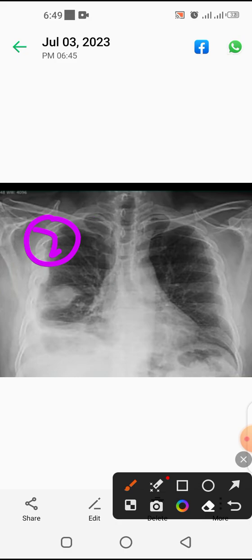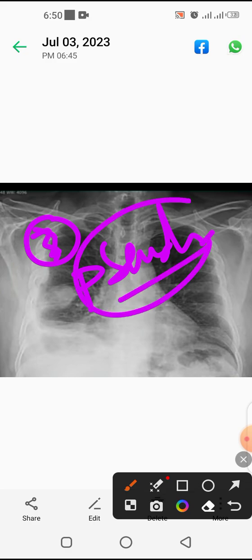Now the third differential in this case would be, if a patient is having opacity and he's having effusion on this side, the third differential will be pseudotumor. Yes, pseudotumor. This can be cardiac failure, and this is opacity. This is the fluid in the fissures. Whenever there is fluid in the horizontal fissure, it looks like that. So effusion with opacity in the horizontal fissure, you should think of transudative collection of the fluid. Yes, this should be the third differential.